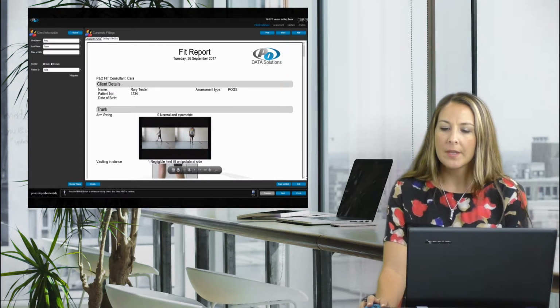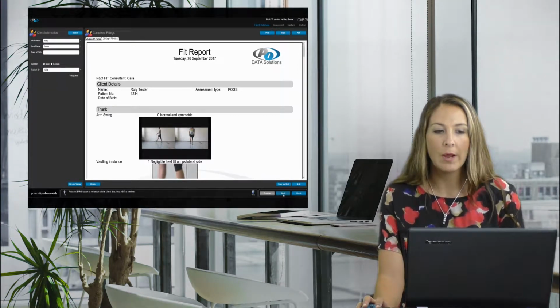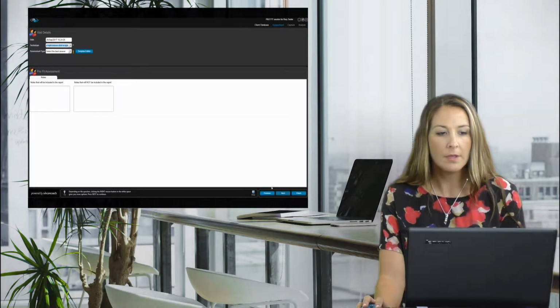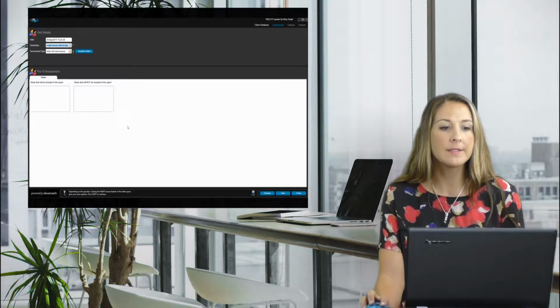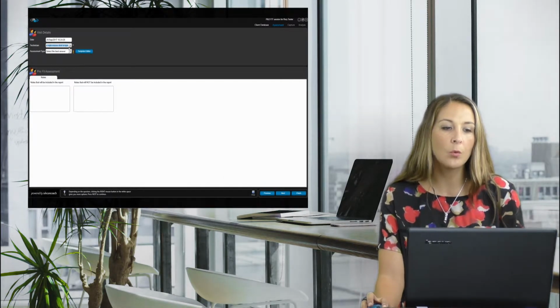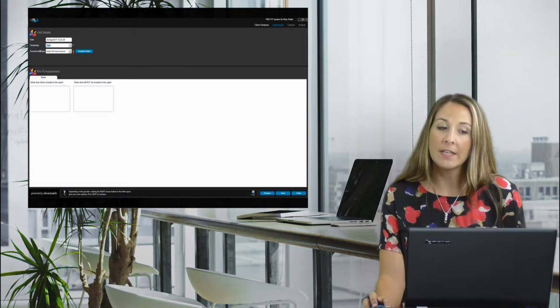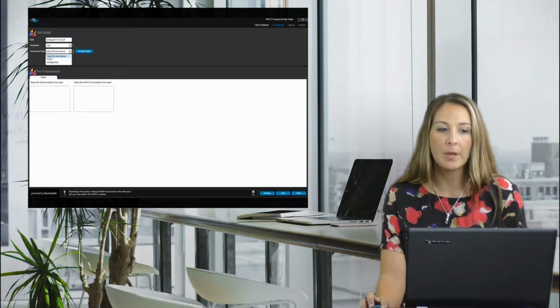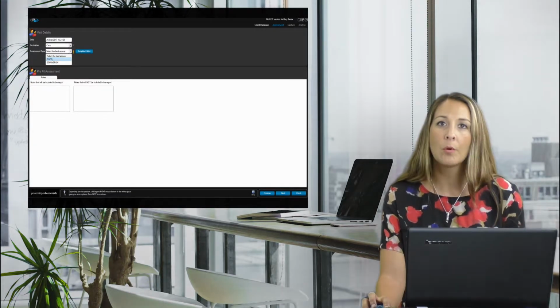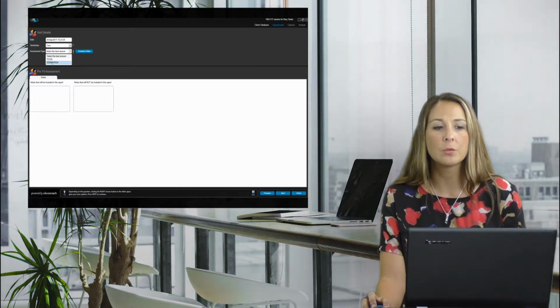I'm going to go to next, because I'm going to conduct a report, or at least show you how we can do that. Today, because I'm conducting a new one, it asks me who my technician is, and I'll click my name. It asks me my assessment type, and it has a drop-down menu here as well. I've got a POGS, which is the Prosthetic Observational Gait Score. All of our reports are based on research-based methods, and the Edinburgh Visual Gait Score.